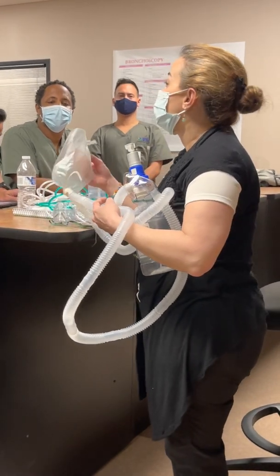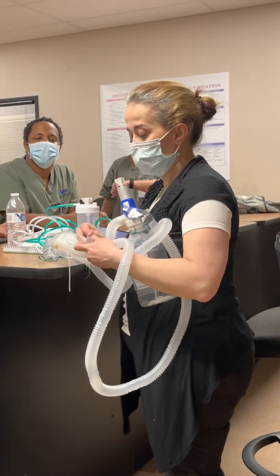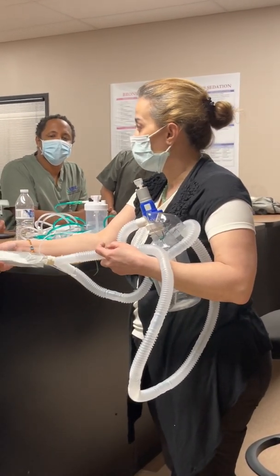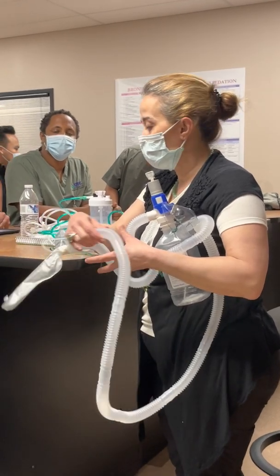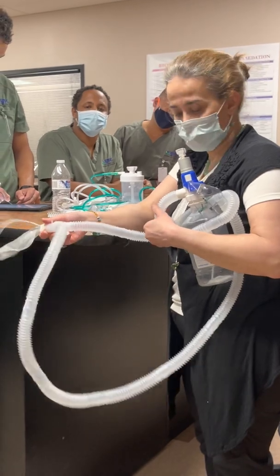Any question? No? That could be placed on a trach patient as well, right? Yes. What is this part called? The attachment one? This one? Yeah. This one is a corrugated tubing. And that one is a corrugated drainage bag. These are all separate items, so each one has different names.